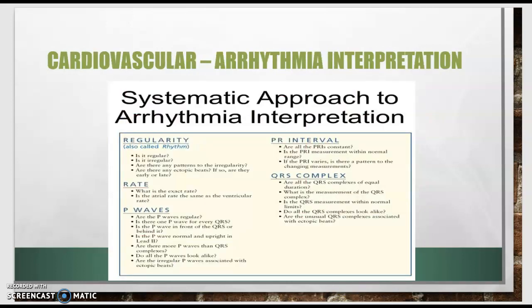I want to go through now and talk about a systematic approach to interpreting EKGs. And so the first thing that you are going to look at is the regularity of it. So if you had calipers, and unless you work on a cardiovascular unit or you are a tele tech, you are probably not going to have calipers readily available to you.